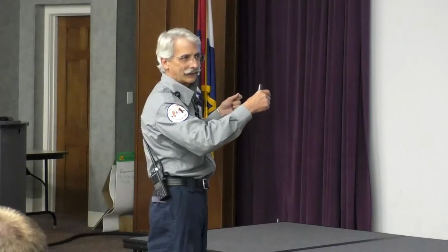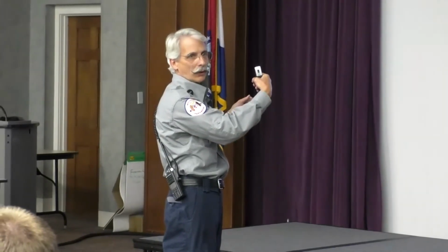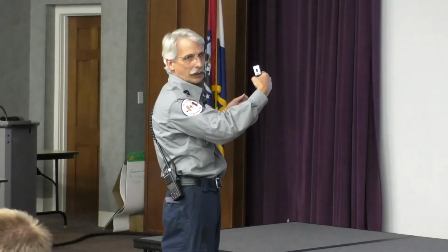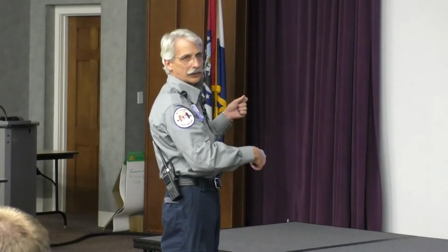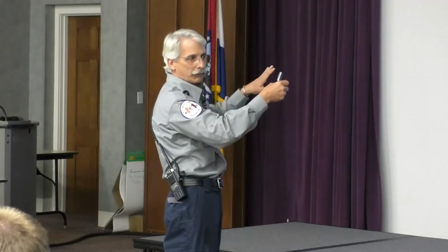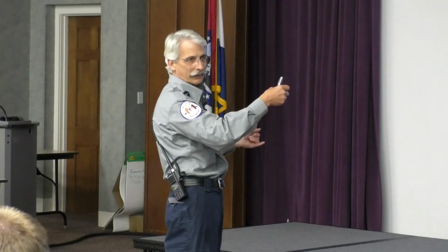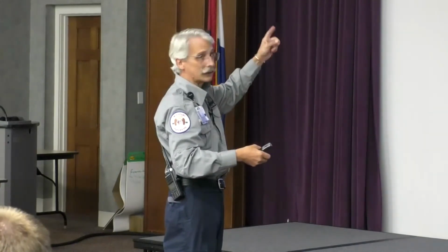So you find the T wave and move back into the QRS. Which way is the first deflection? Down. So if I move my blinker down, which way am I going to turn? Left. So this is a left bundle branch block because I'm looking at V1.